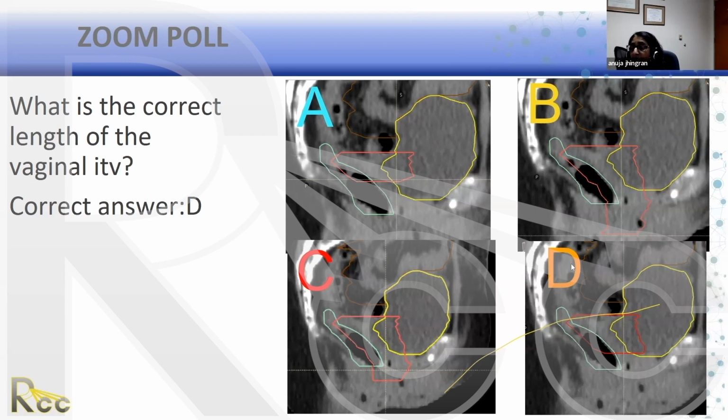Okay, do you put a vaginal marker? So I don't, and that's a very good question. And you can see most of my CT scans, I don't have a vaginal marker. Some people do put vaginal markers. In the old days, prior to us doing CT sims, we would put fiducials into the vaginal apex. I don't do that anymore. There's multiple reasons why we don't do that. I don't think you need it if you're using CT scan to plan, but there's nothing wrong with it. But if you do put a marker, you need to be very careful that you don't push and put a lot of pressure into the vagina and make it peak up. So that's a very good question.